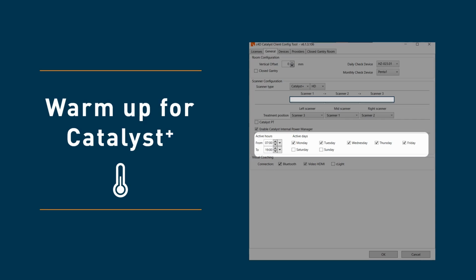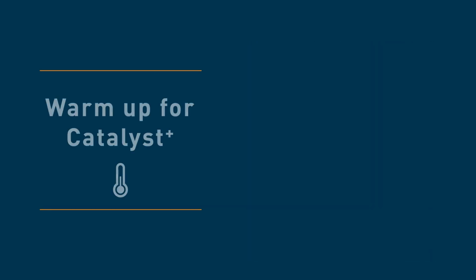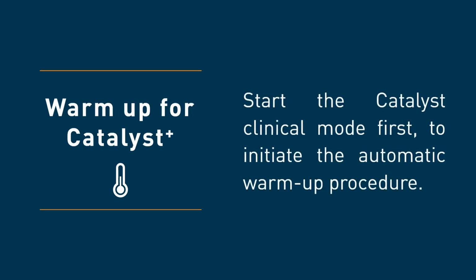During a warm-up procedure, which can take up to 15 minutes for cold systems, it is not recommended to use Catalyst for patient treatments or to perform any quality assurance. However, it is of course possible, with the limitation that the warm-up dialog remains in the middle of the Catalyst screen and that we cannot guarantee full precision. Once the c4D software is shut down, the Catalyst Plus units will be put into sleep mode, which decreases the temperature.